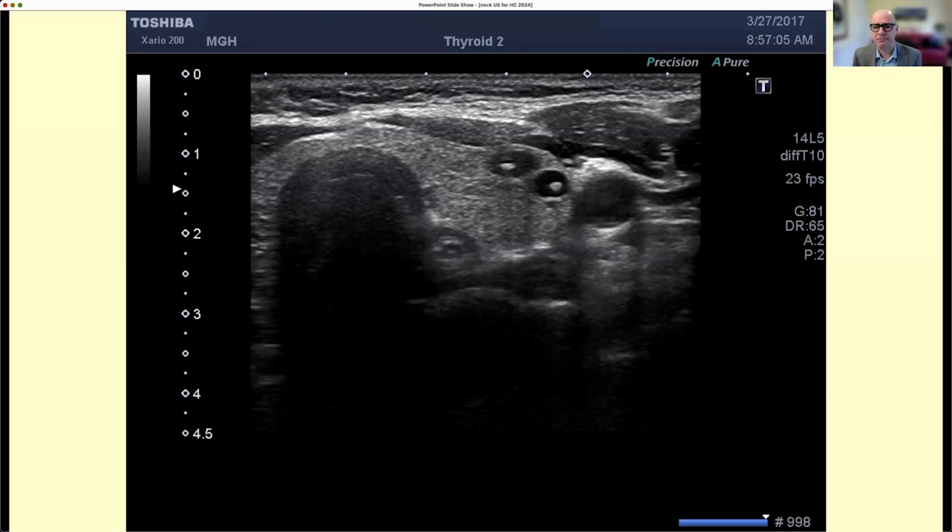Probably not necrosis. But those are the nodules that I showed in advance that are typically colloid nodules, colloid cysts, with some echogenic material in the middle, which I think are crystals that vibrate and generate those images on the ultrasound. But I cannot be sure. But I think they're crystals. And this is a uniform marker of benignity. These nodules don't need any investigation, even when they're large.